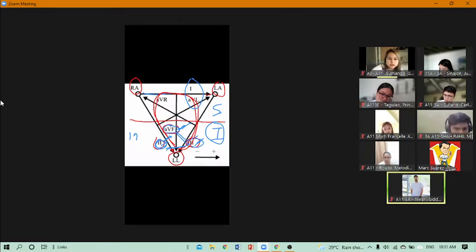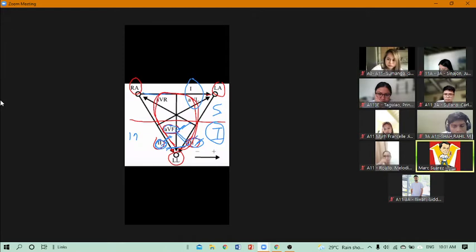Is it clear? Okay, so what do I mean by this? It must follow the all or none principle, or the all or none law. For us to conclude that there is a probable infarct in the inferior wall, we must see an ST elevation on all the contiguous leads, namely lead 2, lead 3, and aVF. Okay?